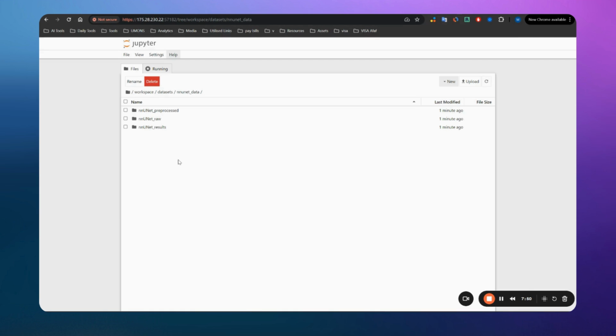So let's just leave it, because what you need to keep in mind, if you are working on a server or something and you close your window and you open it again, then everything you have exported as a path environment will be lost. So you need to re-export it again. And since we are not going to use it now, why should we export it and then redo it again? So for the moment, we just leave it.